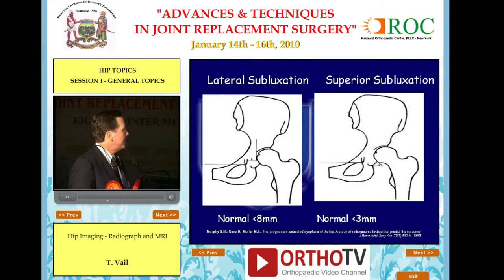It happens that the teardrop is the most reliable landmark in a plain radiograph that accounts for rotation and tilt of the pelvis. So if you were trying to compare x-rays one from another, measuring off of the teardrop is the most reliable angle to measure from. And authors have defined lateral subluxation and superior subluxation based upon difference from the teardrop.